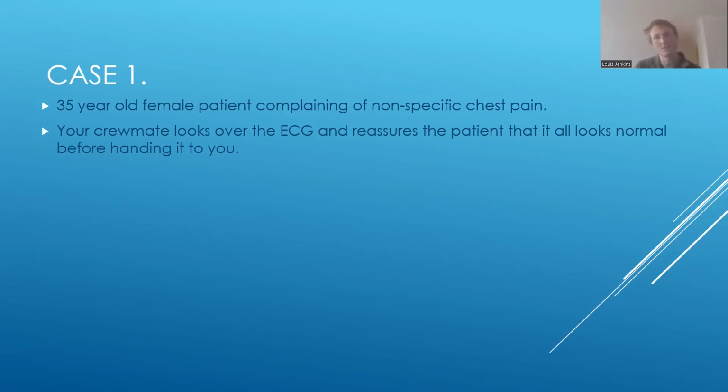So this is the kind of patient whose ECG, I'm completely guilty of doing this, I would be quite tempted to just have a glance over and probably not scrutinize in as much detail as is warranted. So just by throwing in a patient with this age group and this gender, it makes you think about some of the biases that we might have going into looking at ECGs, and to be aware of them, because all ages of patients can have infarcts and all genders of patients can have infarcts. And there's definitely been people younger than 35 who have had infarcts. So just bear it in mind.